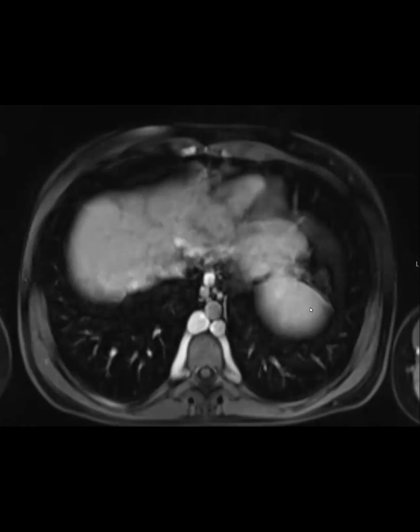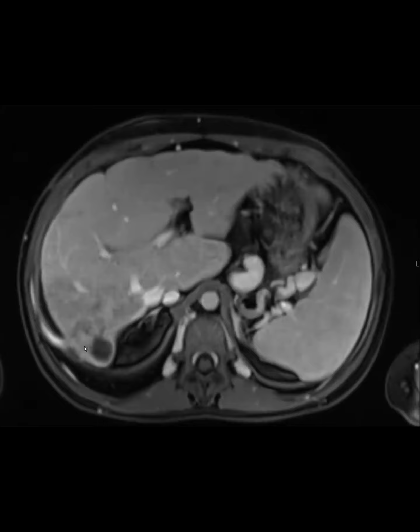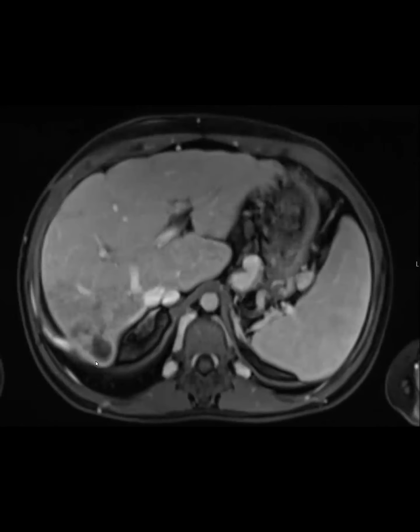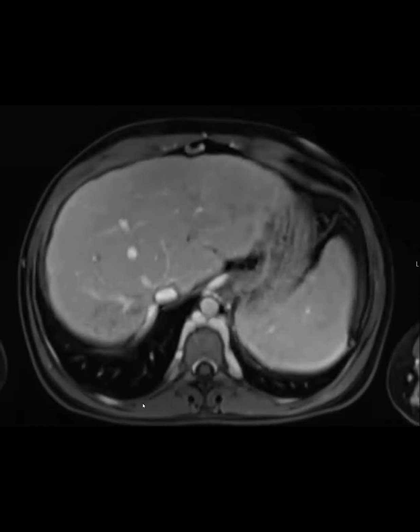I don't like the looks of the posterior aspect of the right lobe of the liver. Yep. Okay, and let's just say there was some treatment change there, all post-treatment change. Good. Excellent. Post-treatment change, yes. So, other findings, and focus on the vessels.